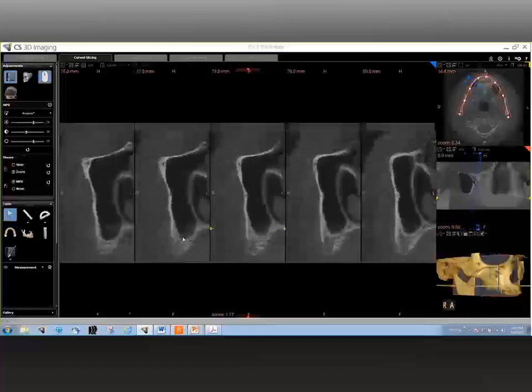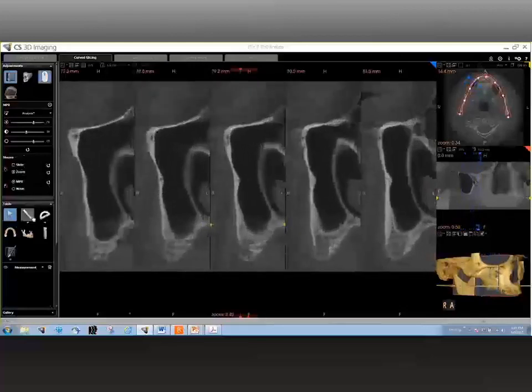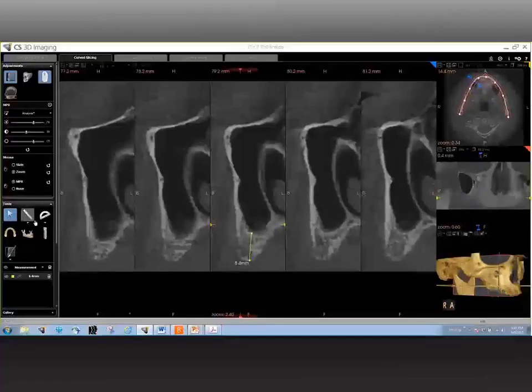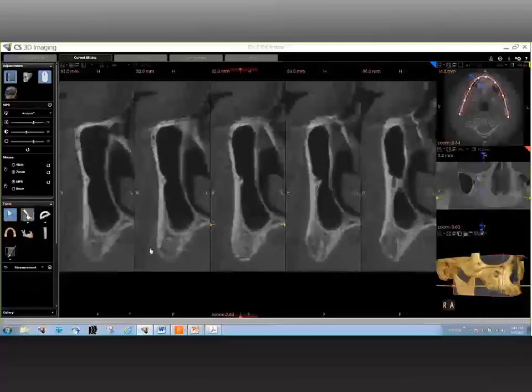And there you see, you can notice now that there's a little bit better ridge anatomy. You're getting a little bit more height, which seems like, from non-existent, it has come to almost 8.4 millimeters. And as you go further anterior, you're able to even gain some ridge width there, in fact, which is actually very good for somebody who wants to get some sort of implant surgery done.